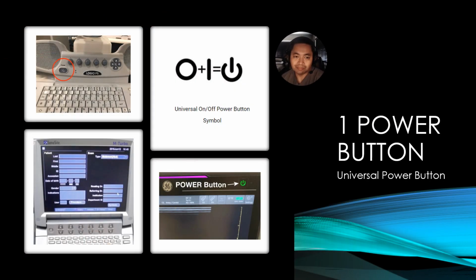Let's start simple. How to turn on your machine. This is the universal symbol for the power button. This symbol applies to most, if not all, ultrasound devices. And most machines have mechanical switches for this. And these are a few examples of where the power button would be located in some GE and Sonosite machines.